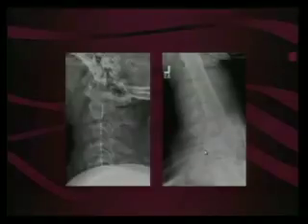Yeah. Here you go, guys. So 2, 3, 4, 5, 6. There's a C6 vertebral body fracture. And of course, we are going to CT it because usually nothing's going to be that simple. You can see a little bit better here. Okay, so it's a C6 vertebral body fracture, and there's also a facet fracture on this one.